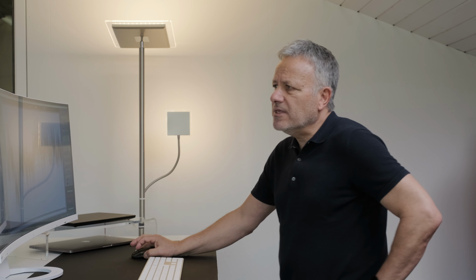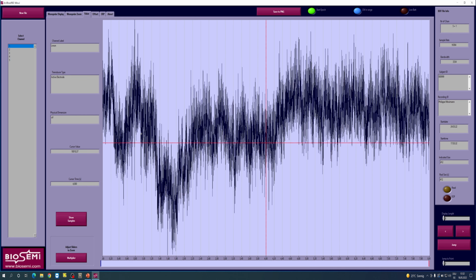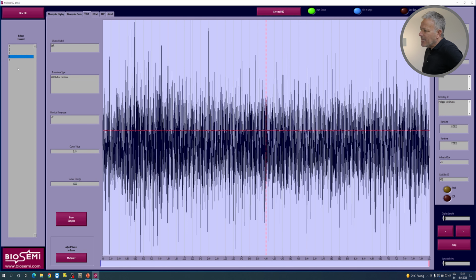There's another tab here. Value is actually an interesting tab, especially if you want to do one-shot triggering, and we need to know how big the amplitude is of the actual one-shot trigger coming through. To scrutinize that, we click on the value tab and we see a trace. We could see a trigger. And of course, you can actually also zoom on that one.